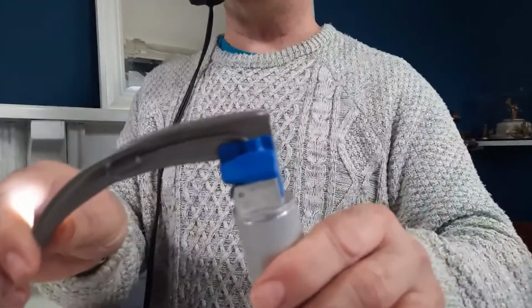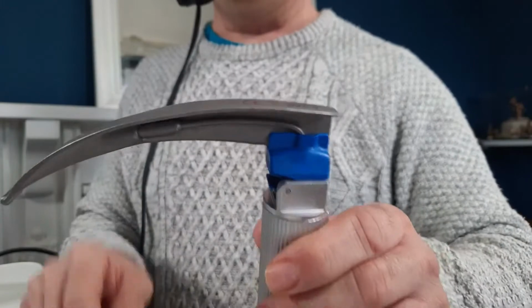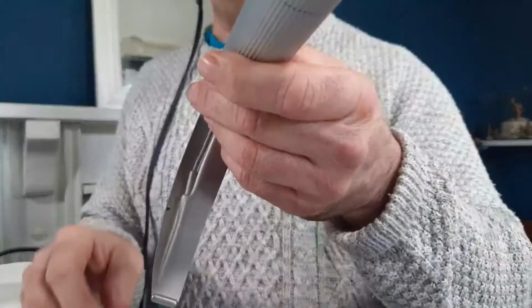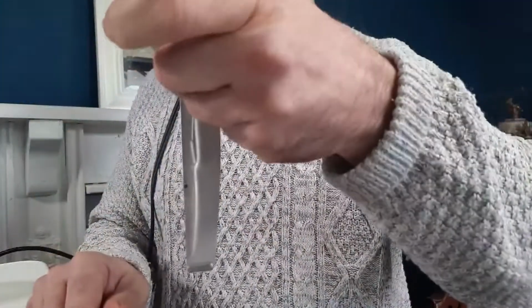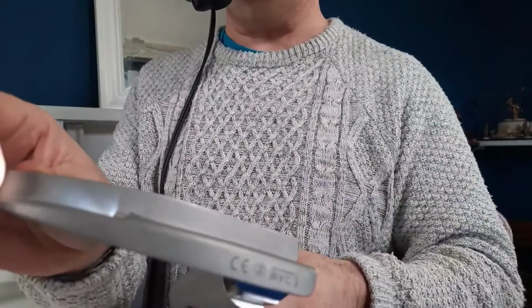It is a very specific shape as well. You can see the shape of it. It's obviously anatomically shaped, so it goes along with the curve of the mouth. And the whole point of this is really to get this end down here, down behind the epiglottis, so that when the person intubating pulls the whole system up, you will be able to see the vocal cords. And it's got this channel underneath it, because what's going to happen is that the person intubating is going to put it into the patient's mouth, is going to gather the tongue under this groove here, and then push the tongue to one side as they lift forward as well. So it is a very specific shape for a reason.